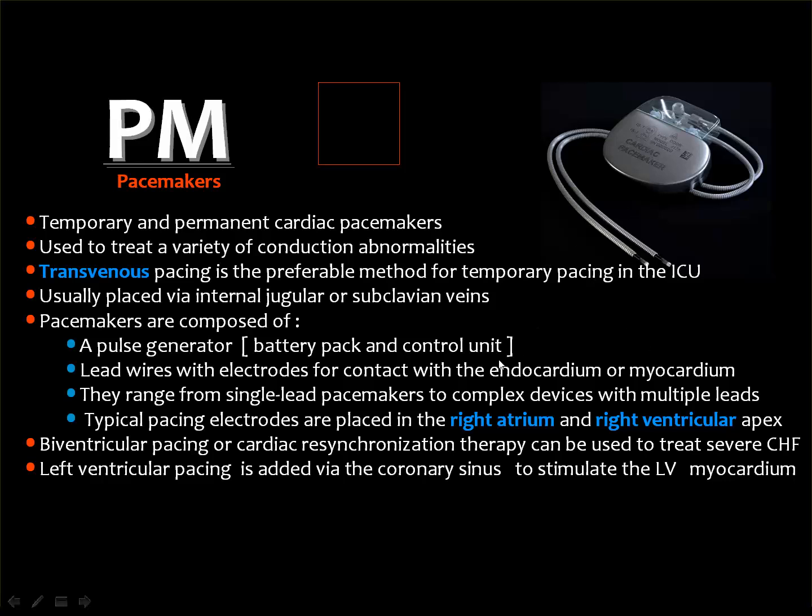The pacemaker is composed of a pulse generator, which is a battery pack and the control unit. This is the pulse generator, and lead wires with electrodes for contact with the endocardium or the myocardium. These are the leads, and there are double lead pacemakers and triple lead pacemakers.